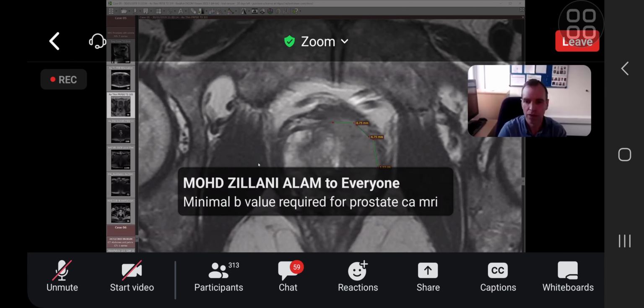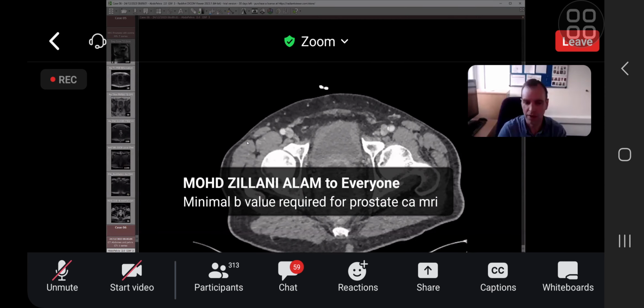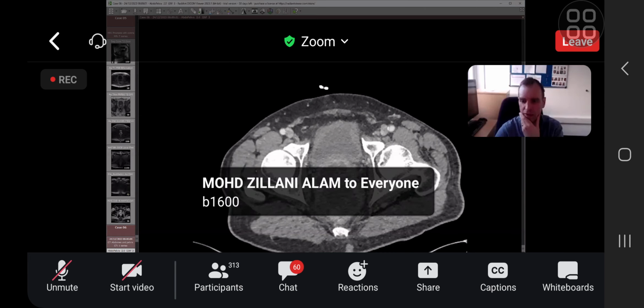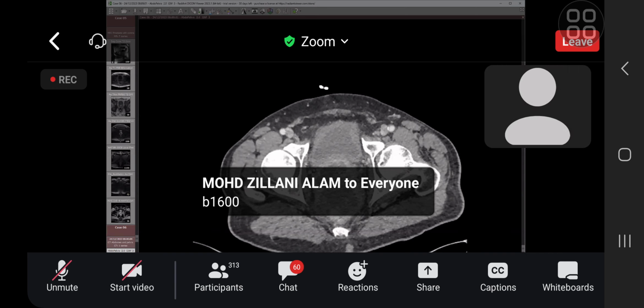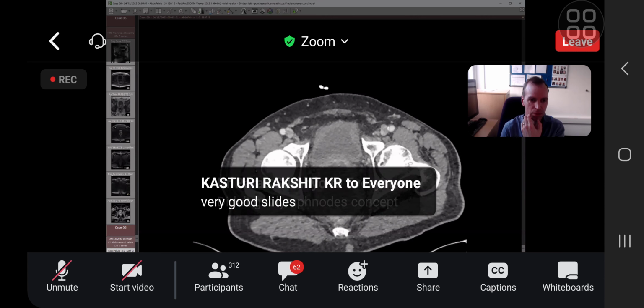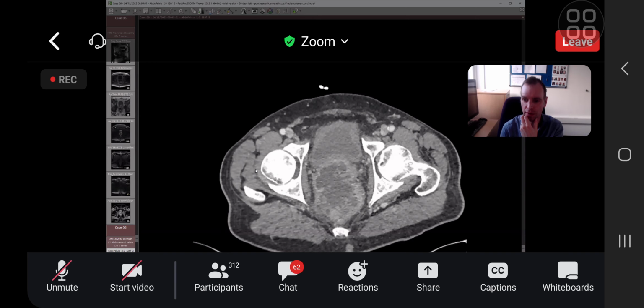So we're going to go to this case, case 6. So you've got just a CT, so you can scroll through the CT. You started with a CT as well. You've got another CT. Yes. That's just the way it's worked. Okay, so this is a 69-year-old man, left lower quadrant pain, blood in stool, CRP 126, DRE no blood, query diverticulitis.